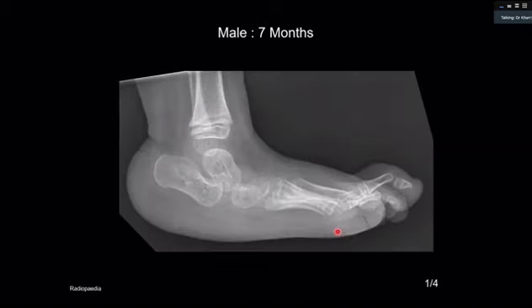So what is your diagnosis? Spot diagnosis. 5-second diagnosis. Are they missing their... They've got rocker bottom feet? Excellent, well done. And what do you mean by rocker bottom feet?